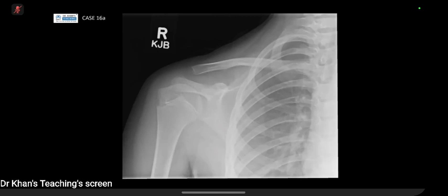Do you want to ask me any questions? I can only see that the right acromioclavicular joint has widening. Okay, so what if I tell you that you can feel a palpable lump or pain at the medial clavicle on the right? At the medial clavicle on the right. Okay, I might see an expansion at the medial aspect of the clavicle, however, no cortical disruption or periosteal reaction.